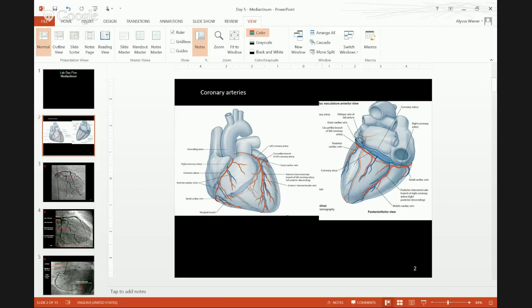Okay, I want you to identify the SVC and IVC. That's pretty hard to see, but you should know in general where those are. So this is where you would find your SVC. Your inferior vena cava, you should find right around here. On my screen in this image, you probably can't see it in the video, it's very slightly darker, so less opacity where the SVC and IVC are. But you should be able to identify those based on location rather than based on things that you see.